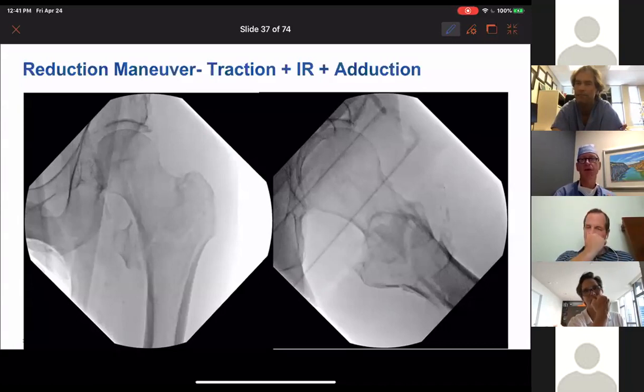And now the ones of these that I have to revise, I find that the hole, I can't draw on a screen, but the hole isn't just too lateral. The hole is also too anterior. And that's because they operated exactly on this view and they thought they were in the middle, but in fact, they were on the front of the troch, right? Yeah, right.